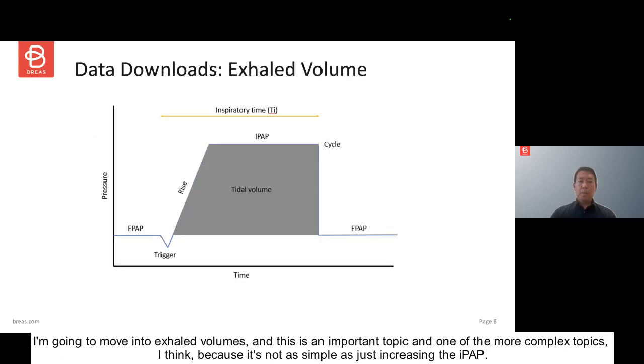So I'm going to move into exhaled volumes, and this is an important topic, and one of the more complex topics, I think, because it's not as simple as just increasing the IPAP.